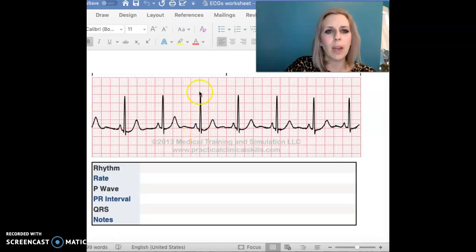This is our Q wave, R, S. Okay, we have a normal PR interval. And we have this normal QRS complex. Okay, so we're going to see this T wave as well and a normal pattern rhythm here. This is, again, normal sinus rhythm.